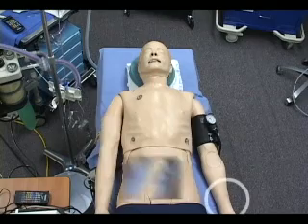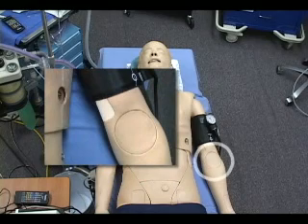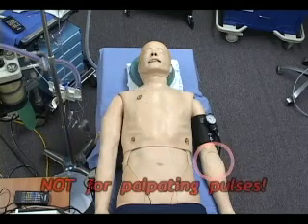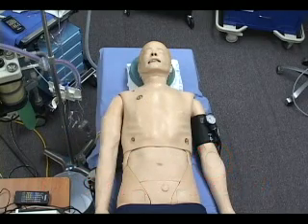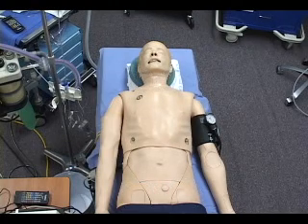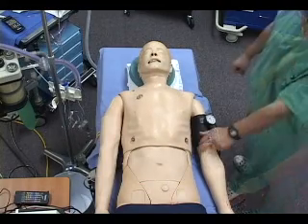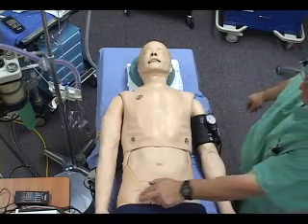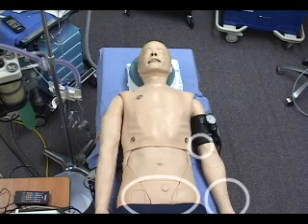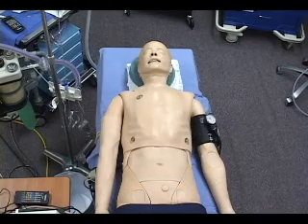SimMan has a left radial and a left brachial pulse. Note that adjacent to the brachial pulse is a circular area that is used for auscultating blood pressure, not palpating pulses. SimMan also has bilateral femoral and carotid pulses. Note that there are no pulses in the right arm or the lower extremities. The radial, brachial, and femoral pulses are mechanically actuated. These 3 pulses are present at all times, but can easily be obliterated. A delicate touch is sufficient to palpate them.